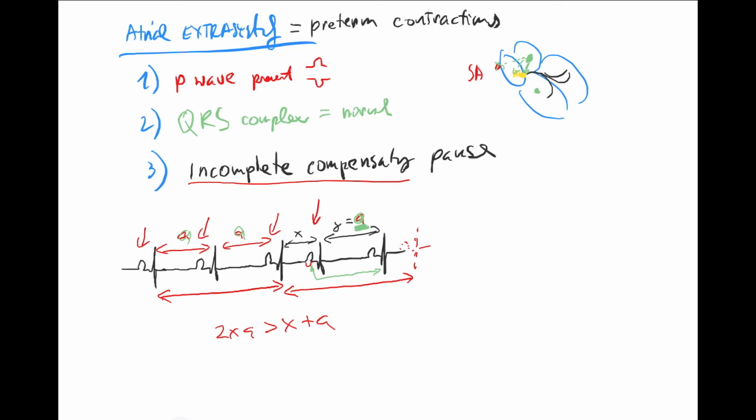So if I ask about the hemodynamics now, how much will the ventricles release during this extrasystole? What do you think? Well, they will release less because they have less time to fill. But during this normal contraction, they have a normal time, and they will eject the same amount as normally, as over here or over here. It's like over here you're flushing earlier before the bucket is filled, and over here you got normal time.